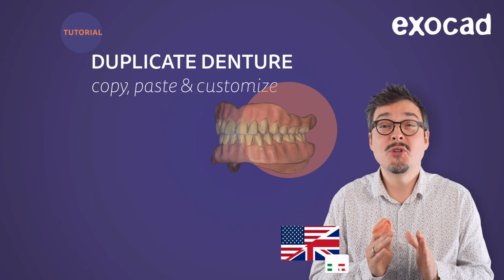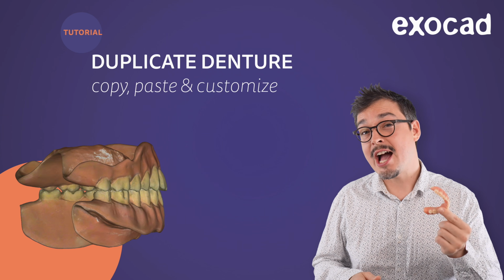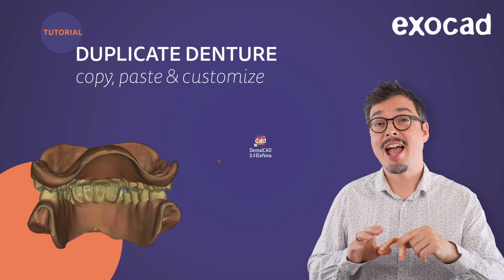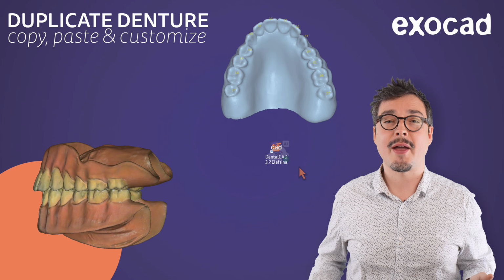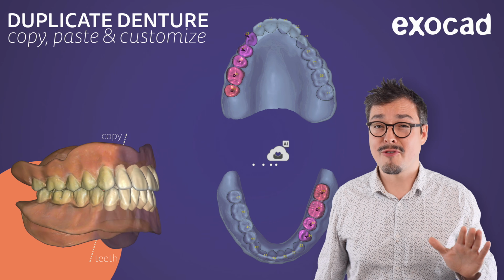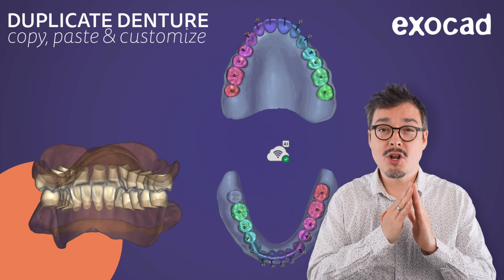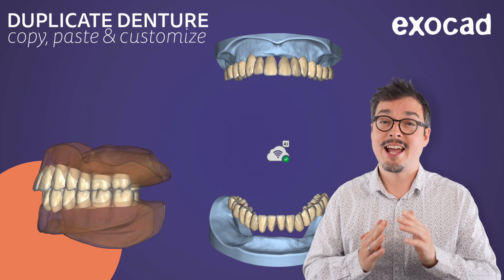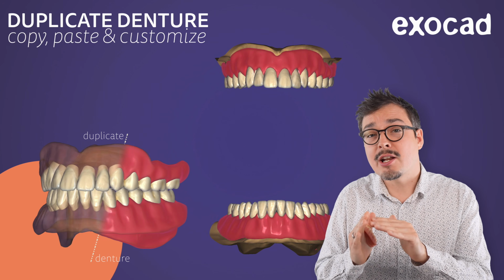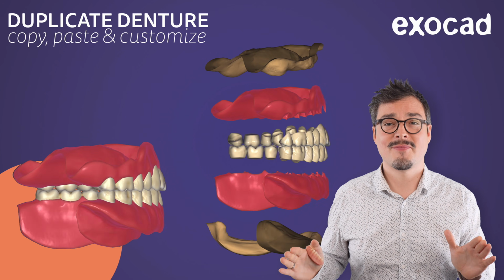Let's discover the Duplicate Denture feature together. All you need is a 360-degree scan of your denture and DentalCAD 3.2 or higher. Lean back and watch the reverse engineering. First, by separating all the teeth automatically thanks to the innovative tooth segmentation. And second, by swiftly generating the fitting surface of the relined denture base in no time.